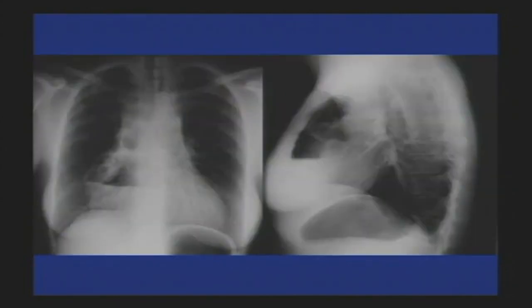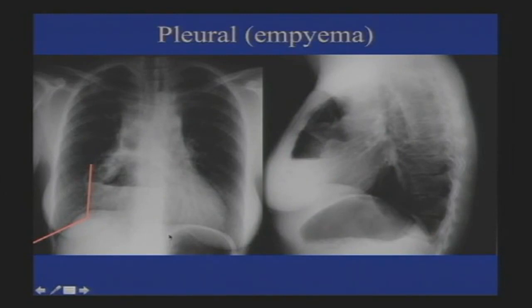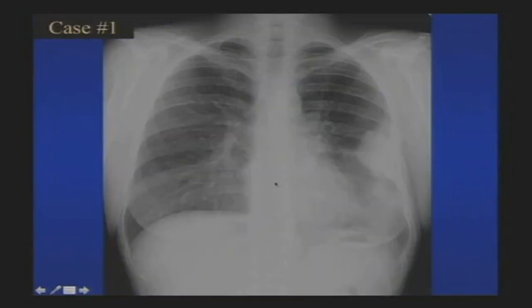As opposed to this, which is fairly elliptical. It looks like it's growing sort of more superior, inferior, and not so much anterior, posterior. So it's much larger in this dimension. Looks like nice border here, but you don't see any border in the lateral view. So significant portions of the border are ill-defined. And where it touches the diaphragmatic pleura, that angle is obtuse. That's a pleural empyema, and that has to be drained because antibiotics usually don't treat these appropriately.